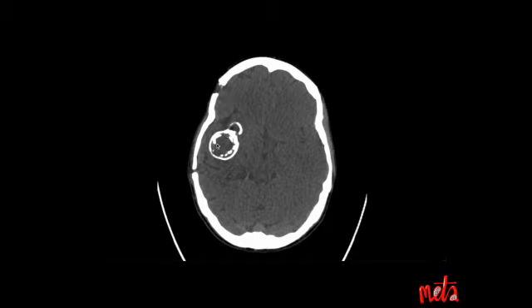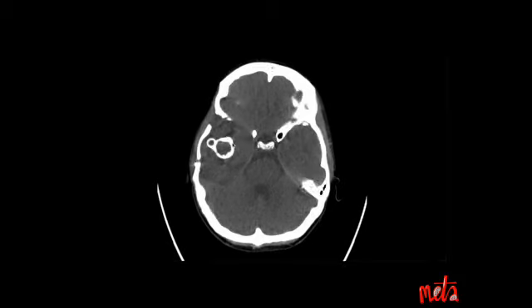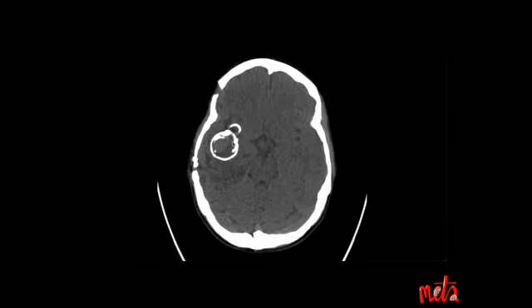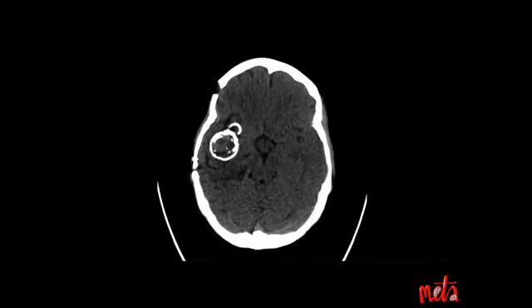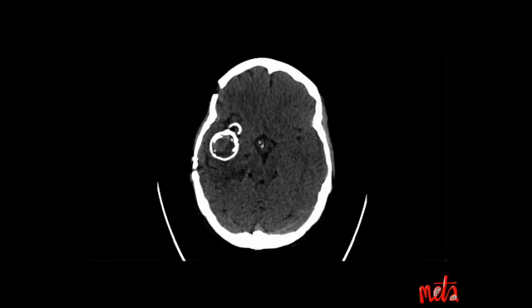Sometimes you don't always need a CTA for correlation. The answer is readily apparent in the non-contrast brain, as it is in this case. So this is a multilobulated, densely calcified right MCA aneurysm, and you can even spot, when we window down, the heterogeneity within the center of the aneurysm. We know from the previous case that the hyperdense components or brighter components within the aneurysm represent thrombus, and the darker components beside them represent the normal filling or the opacified part of the aneurysm with blood. So this is a heavily calcified and partially thrombosed right MCA aneurysm.